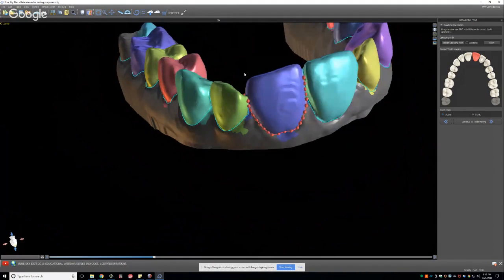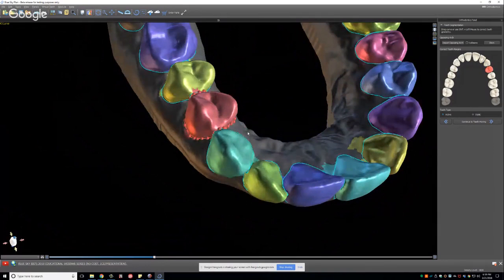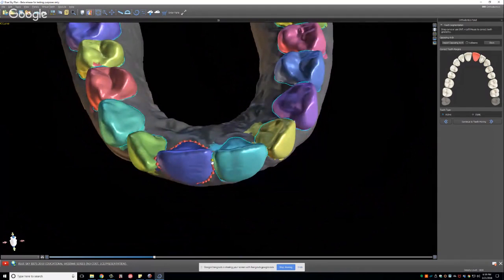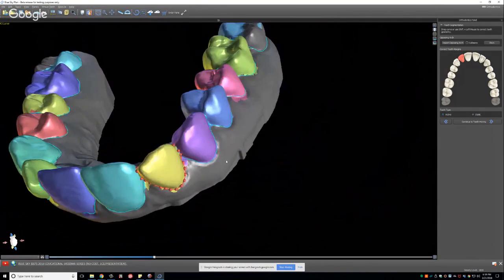And the last thing we want to do is make sure that the line never disappears over the incisal embrasures. Just make sure you bring up one of these nodes so that it crosses that line. Otherwise, you can have some segmentation errors. Segmentation means as the software tries to separate the teeth into individual segments, or teeth in our case, if you have the lines disappear, it doesn't know where to cut above that line. So you're just introducing error. So I always just go to typically the buccal, grab the highest one up, and just bring it over top.